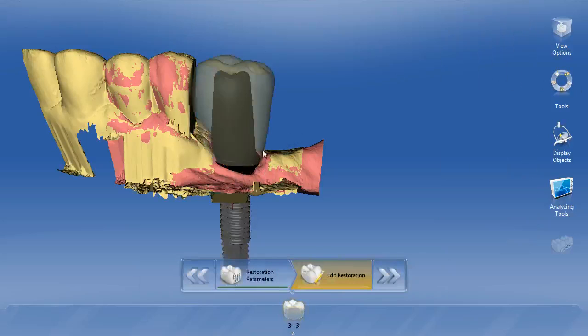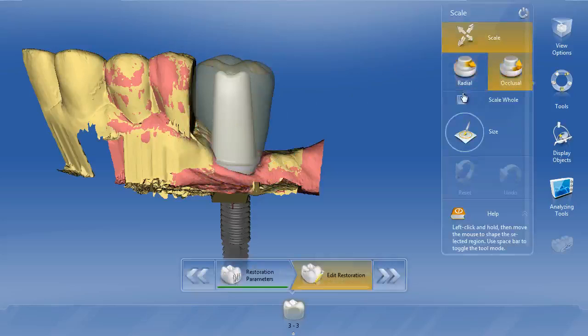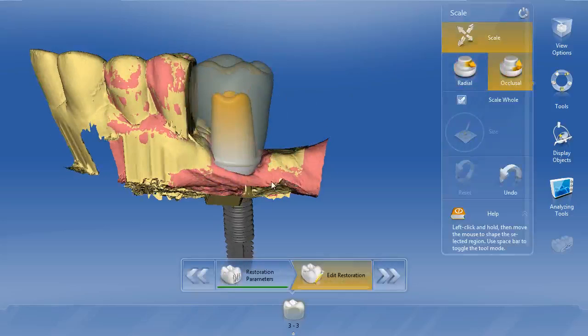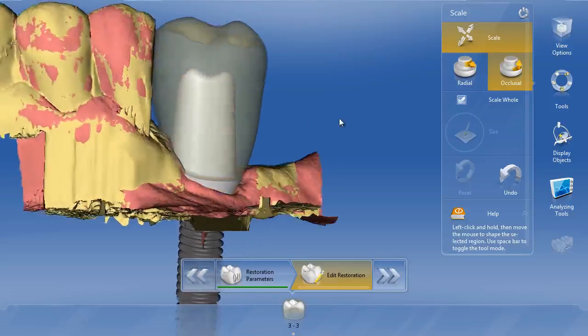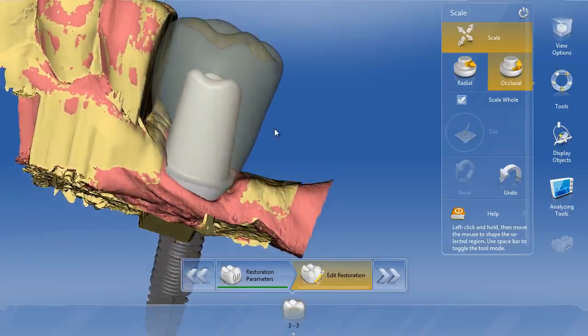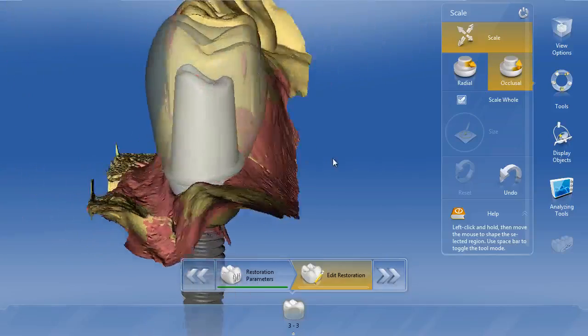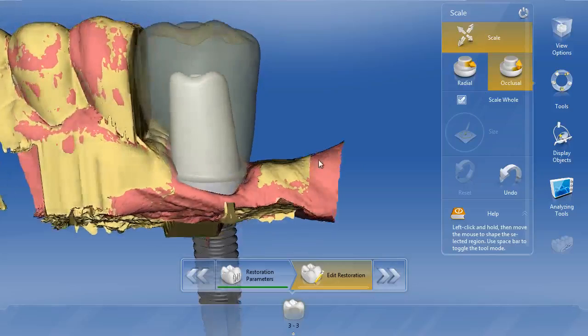even though in this case sometimes you'll get a little white there. If you click on a tool, it goes away. Or excuse me, black. So sometimes you're going to have scenarios where there's just nothing you can do about it here. You're going to have that margin above the level of the tissue, so you're going to have zirconia showing. Probably not a huge issue way in the back here. So you have one or two options. You proceed in this direction here, having some of that zirconia be above the level of the tissue. It has good emergence. The tissue will shrink up nicely. It's just a fine situation.